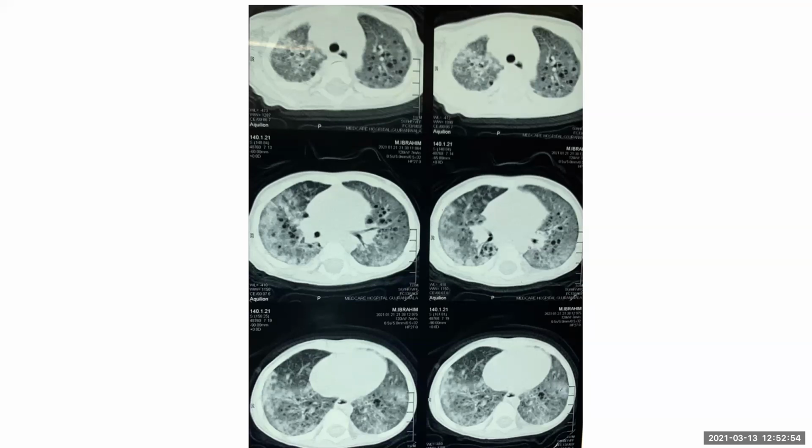This patient now had fever and cough. Definitely now it's a superadded infection on the background of an underlying condition. What underlying condition can you think of in a child with cystic lung disease? This could be a CPAM, but these are very tiny and bilateral.